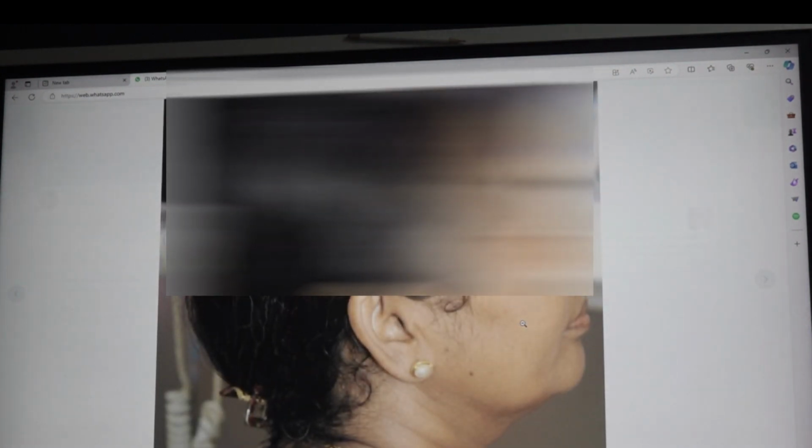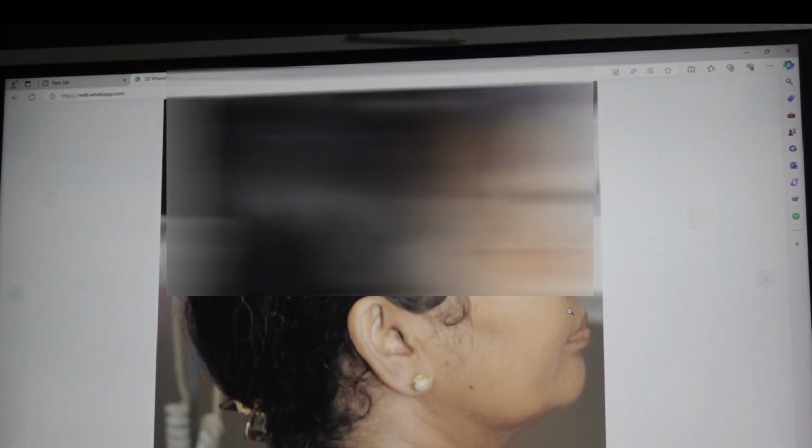Take another profile. She is looking upward actually. How to take? When the opposite wall is very close, this kind of mistake will happen. This is a difficulty. You have to manually adjust the head position.